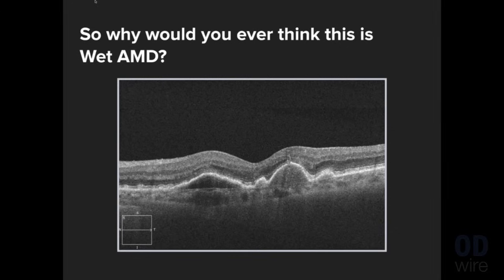It sort of makes me wonder, though, why would anyone ever think that this OCT image is wet age-related macular degeneration? Well, there's probably several reasons why people might actually think that, but we're going to go through some findings today that I hope will help you prevent this as a stumbling block and catapult you to some new skills.